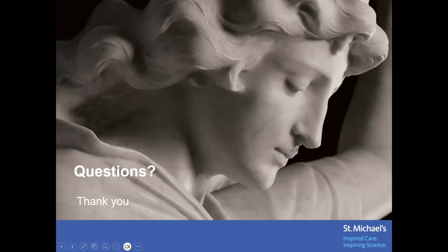When we think about being the most sensitive at picking up stenosis, using the central jet is still helpful because that's where the flow acceleration is going to be the highest. It's just important to be aware that the central jet is not representative of the full valve itself. The gradient may not be as high if you include the lateral orifices, but looking at the lateral orifice will probably end up underestimating the overall stenosis too.